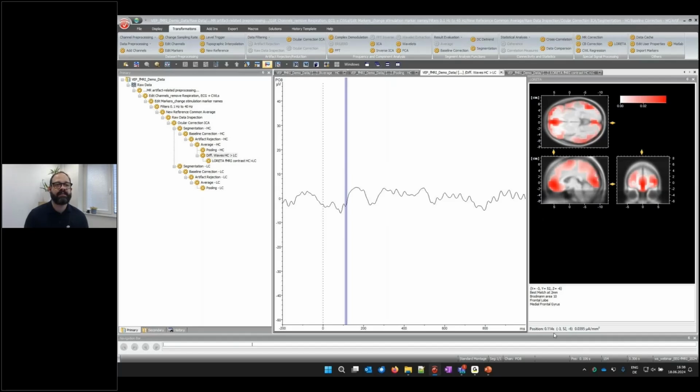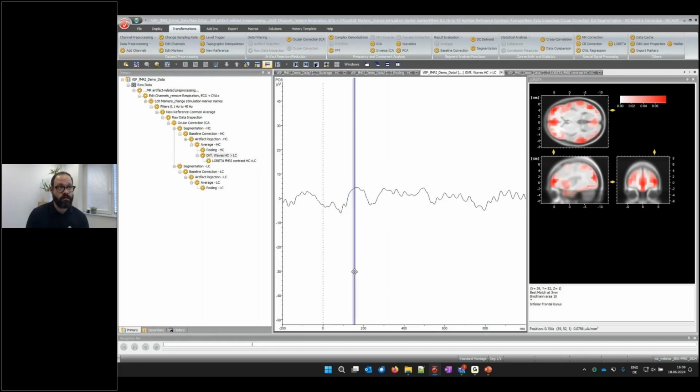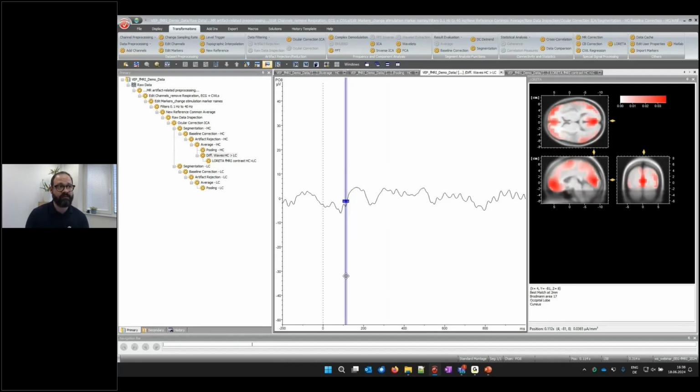And you see definitely there is something happening frontally, there is something happening in posterior areas, and at this point here, the maximum is in Brodmann area 10, so that's something in the front. Well, let's see. Oh yeah, if I go a bit earlier, I get 17, occipital lobe. And let's go in the other direction. Yeah, okay, so in the very beginning here, in the small dip, which is even a little bit closer to this, I get this Brodmann area 17. So this is definitely something I would be interested in, because like Brodmann area 18 and 19, Brodmann area 17 is visual cortex, even primary visual cortex. So this could be something to look at.